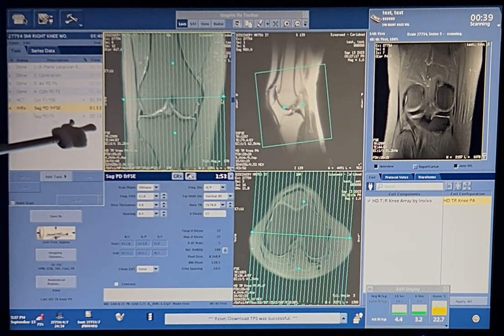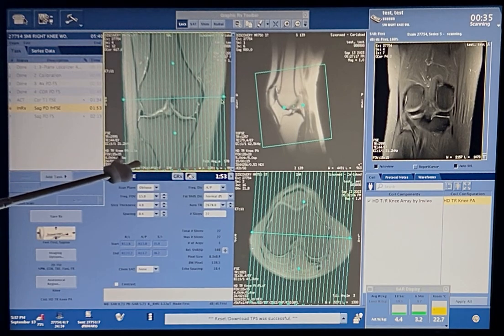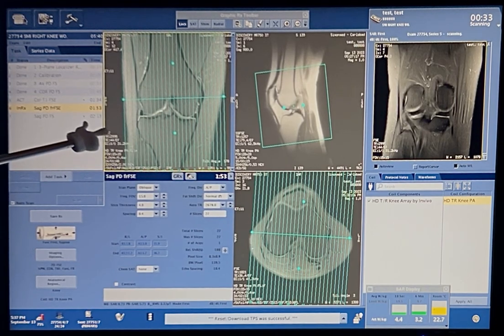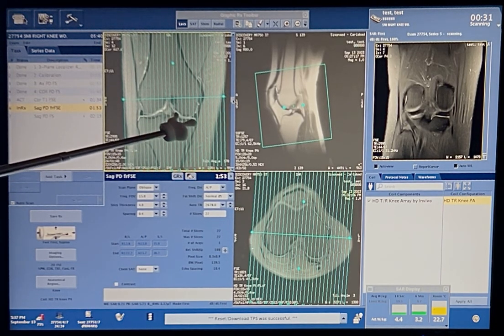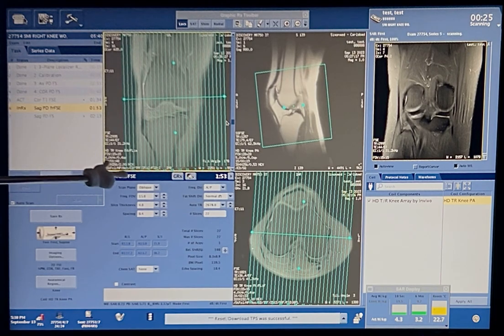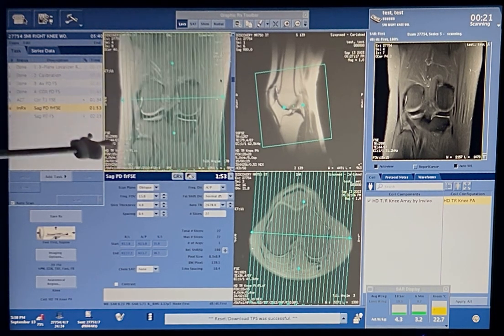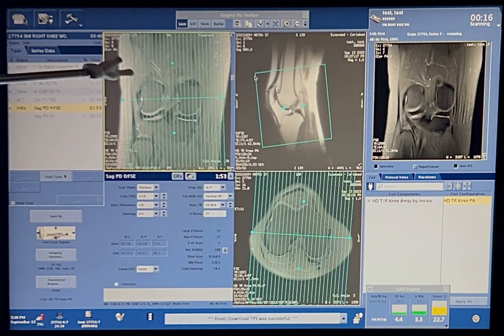Hold on, stop right there. You see how the tibia has this indentation? That means the fibula resides right here, and that means it's the lateral aspect of the tibia, whereas this side doesn't have nearly as much. Does that make sense? It's another indicator. But you can always tell that once you see the fibula, you're lateral. That it's the lateral aspect.